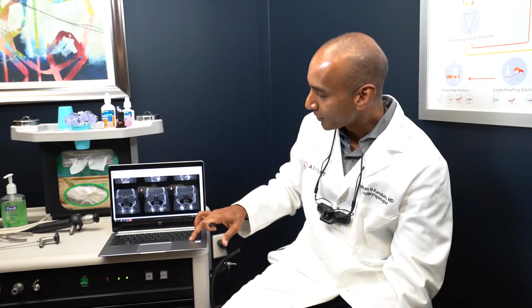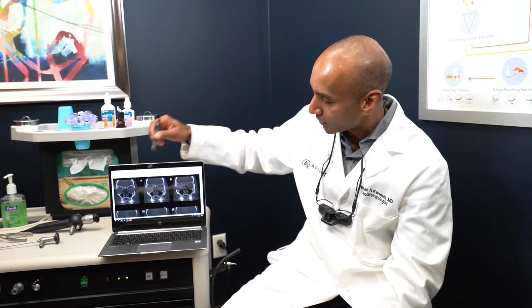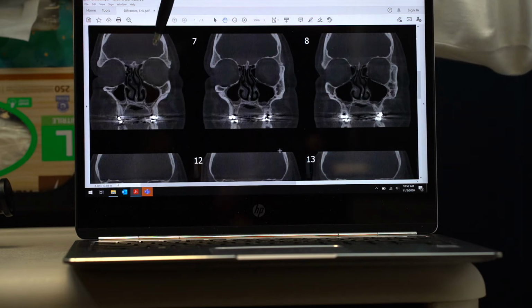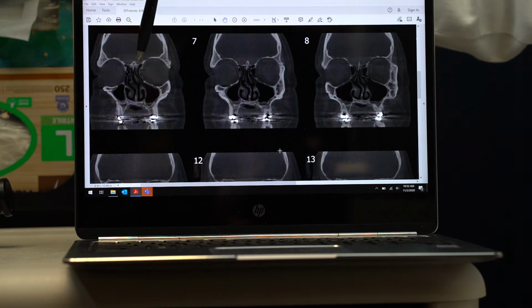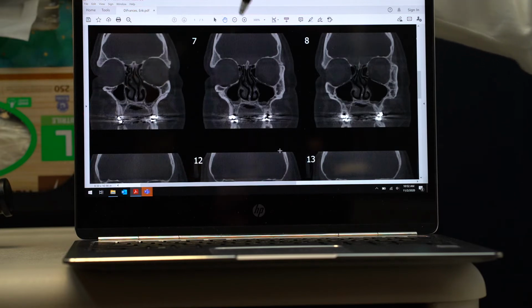and so we see that white, that's a sign that somebody's got some metal fillings. As we go further back in, we continue to see the same structures, and we're just following this going backwards. Left eye, right eye, this is actually the patient's brain up here. This is the inside of the nose. The septum at this point takes a pretty significant curve side to side, towards the right-hand side up high, left-hand side down low. We continue to see the turbinates, and now we see the cheek sinuses here and here.